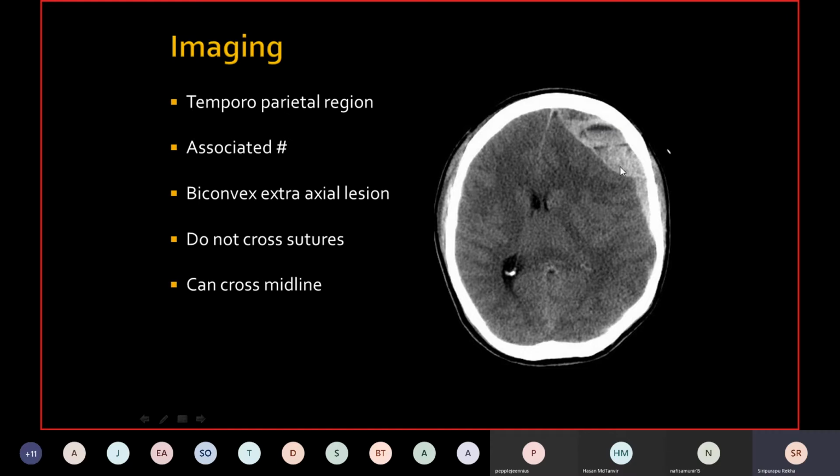The reason the acute hematoma is dense on CT is because the blood has clotted. It is the clot which gives the high density on CT. Therefore, when we have blood which is still bleeding or extravasating and not yet clotted, we will see fluid levels. One of the other things to remember is if the patients are on anticoagulants. So that's a typical example of an extradural hematoma.